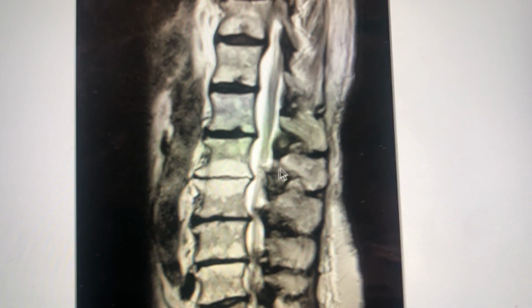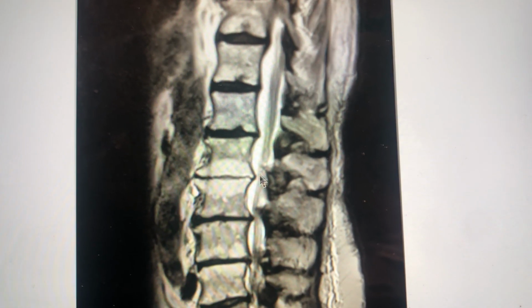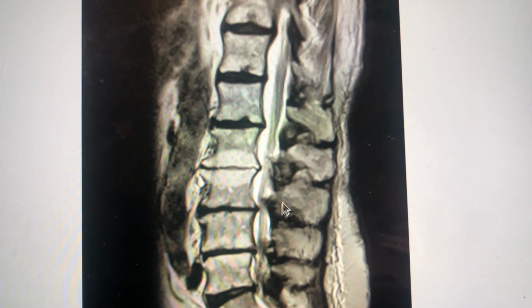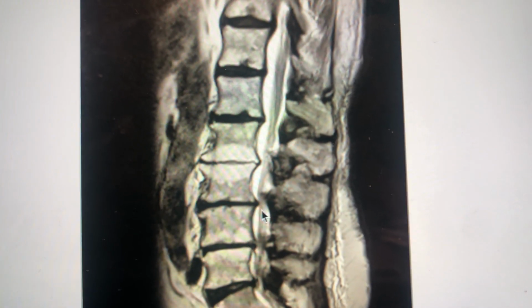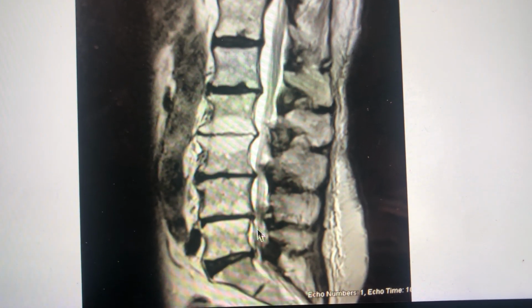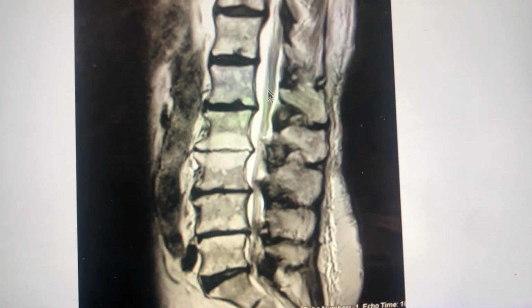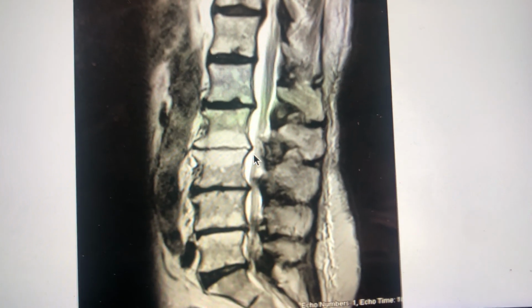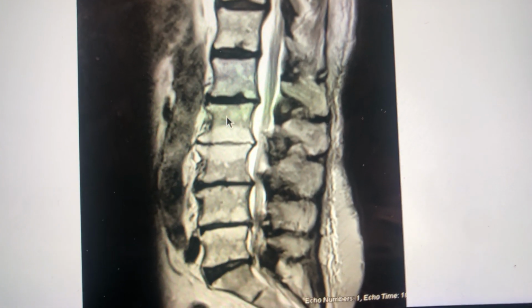Down here we get into some enlargement of this ligamentous tissue that makes the canal begin to be more narrow here. There's enlargement of the ligament here, as well as the joints back here. These combine to make the canal pretty narrow at this level here, a little wider there, and narrow at the successive disc levels throughout here. So she's narrow or stenotic throughout the lumbar spine generally. This is just one sagittal image, so we'll look at other images, but you get the idea what's going on here. She's just compressed at multiple levels.